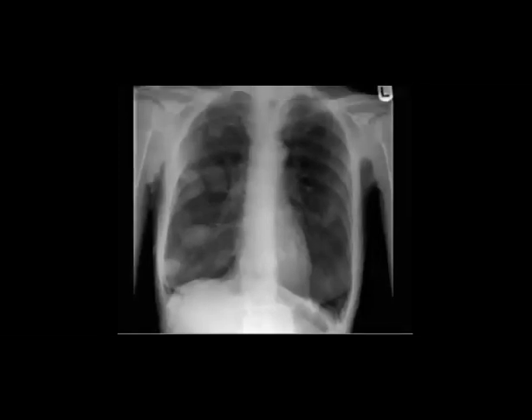But do you see anything else? 1, 2, 3. 1, okay. 2, 3.